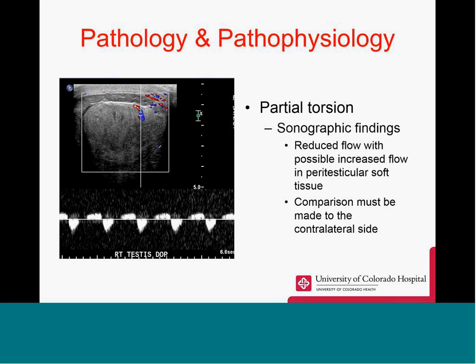Here we can see a partial torsion with a reversed end diastolic flow. Here, this is normal antegrade systolic flow, and then here's our reverse diastolic flow.